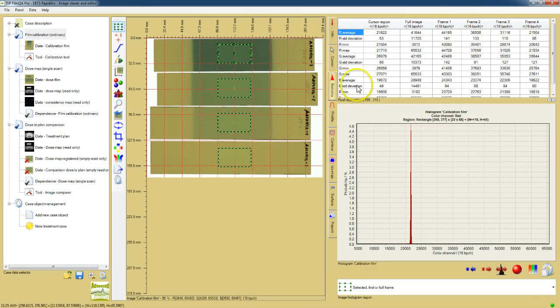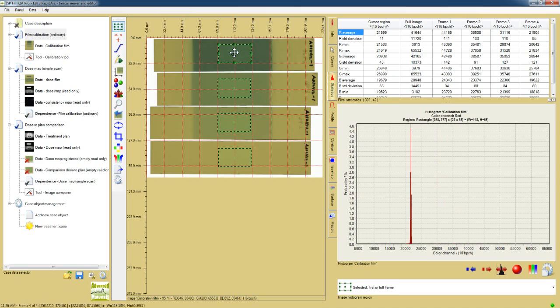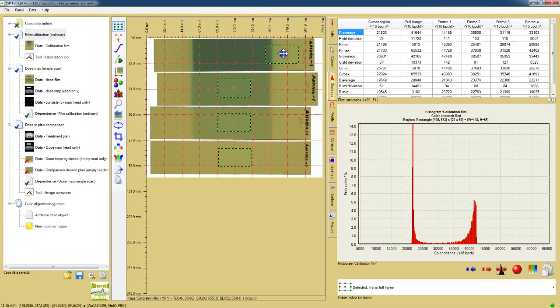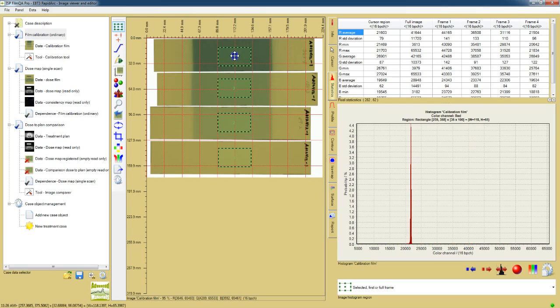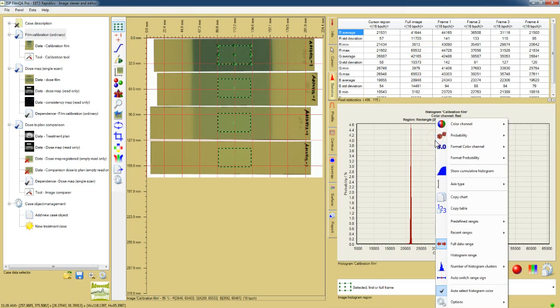The Statistics tab displays response or dose value information for the image. Values are given in tabular and histogram form for the entire image area, the region around the cursor, as well as all regions of interest defined on the image. The display is live, as you will see if you take an ROI and drag it around the image. Right-click the table or the histogram chart to copy either to another application.